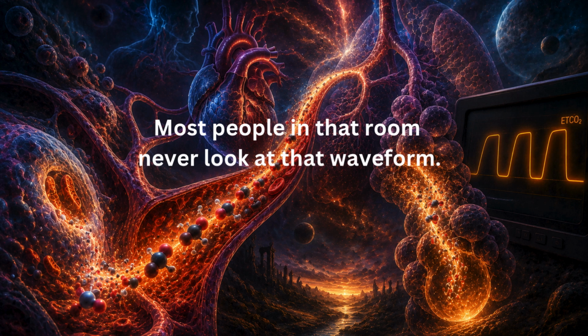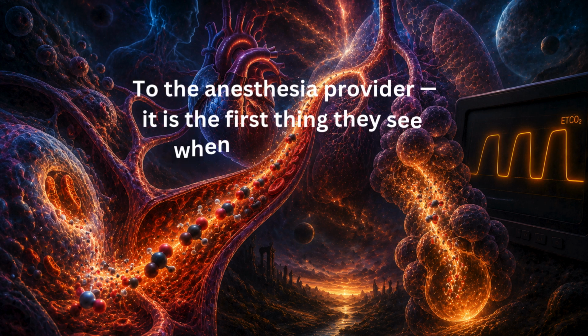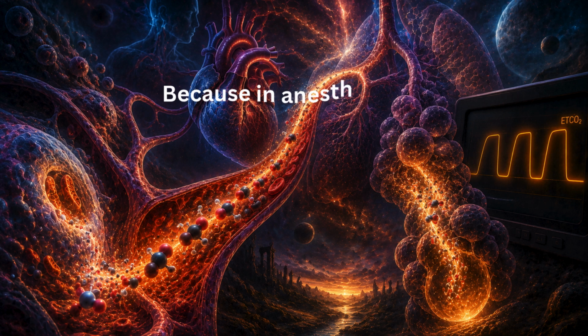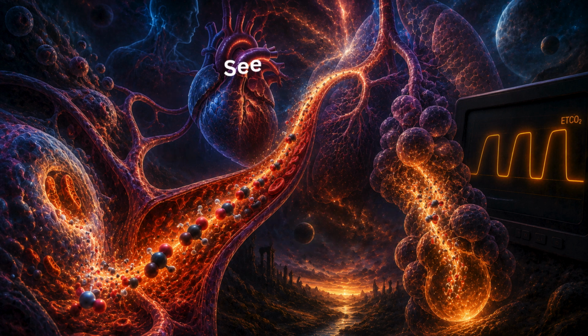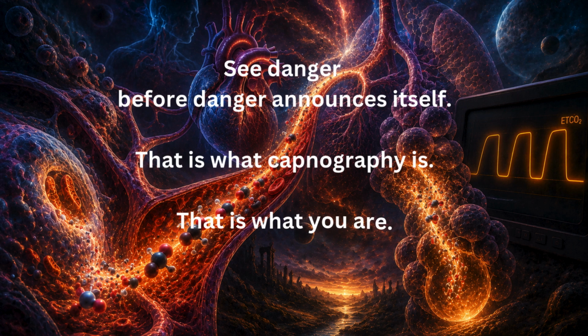Most people in that room never look at that waveform. To the anesthesia provider, it is the first thing they see when the case starts, and the last thing they check before they hand over care. Because in anesthesia, carbon dioxide tells the truth first. And the people who know how to read it see danger before danger announces itself. That is what capnography is. That is what you are.